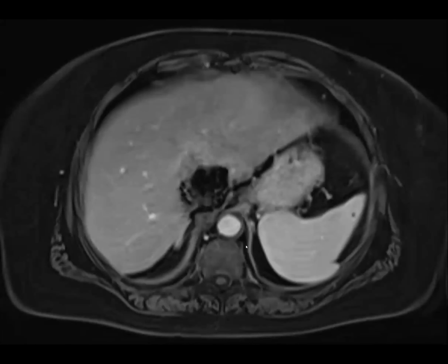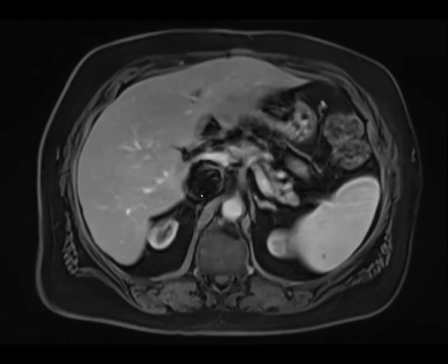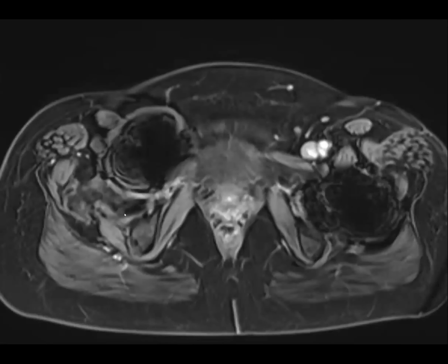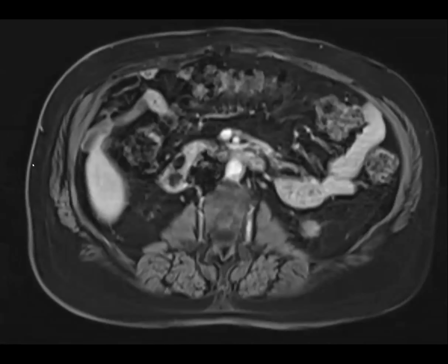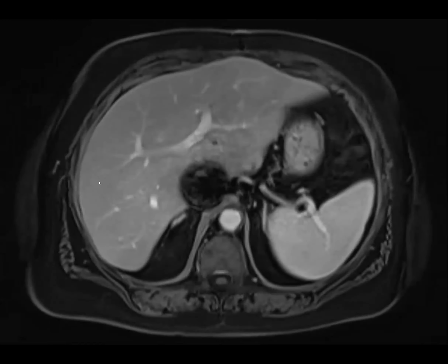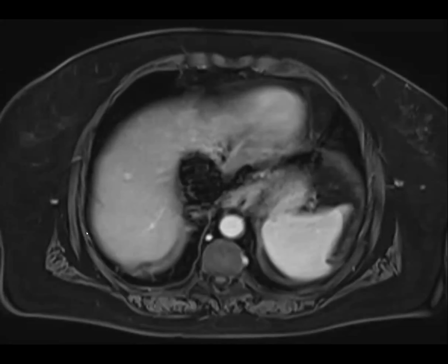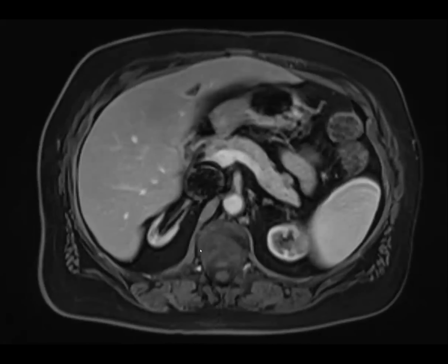It was really mysterious, like a cannula that goes from the femoral all the way to the heart, like an ECMO. But this is an outpatient, not on ECMO. Maybe a femoral dialysis catheter. We didn't go deeper into it. We just said there's an artifact.